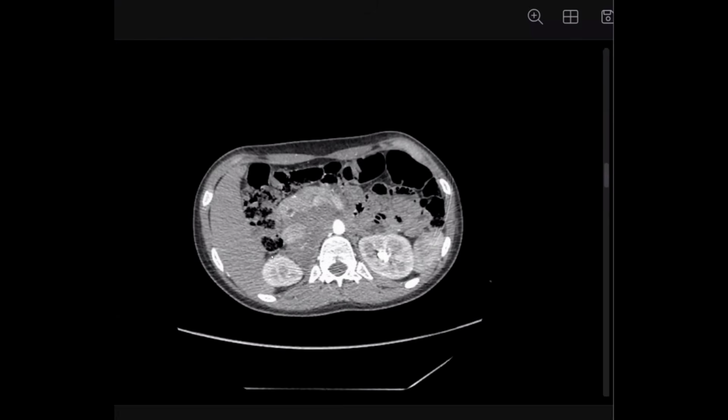Considering the masses in the retroperitoneal region, you said retroperitoneal sarcomas, lymphoma. We already ruled out lymphatic malformation, it cannot be retroperitoneal. We have one important differential in this case. What else? I can appreciate the whole outline. Neurogenic tumors. Don't forget neurogenic tumors.